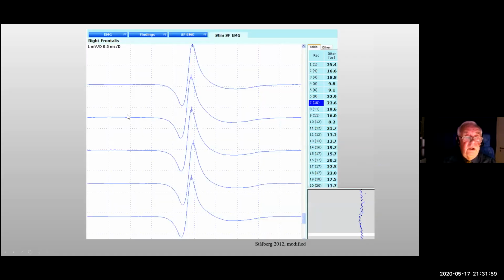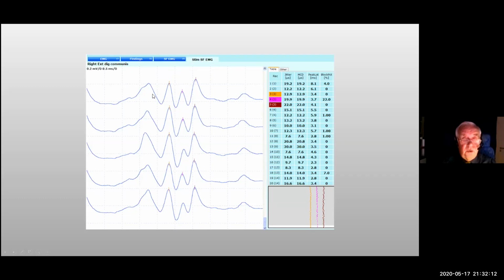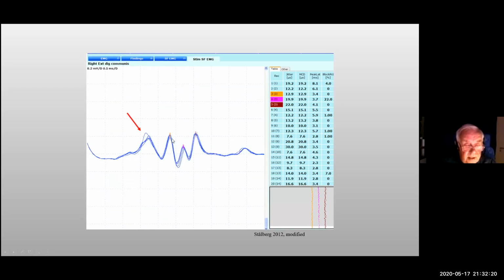And here are now some examples of electrical stimulation. We have stimulus to the left here, and here you see very nice recordings, and when we superimpose, fantastic. Here is 1, 2, 3, 4, 5 spikes, fibers, and then when we superimpose, we see parallel, but this one is obviously a summation. So we skip this one and we record between stimulus and this, and this, and this. So we get 3 values, 12.9, 19.9, 22.